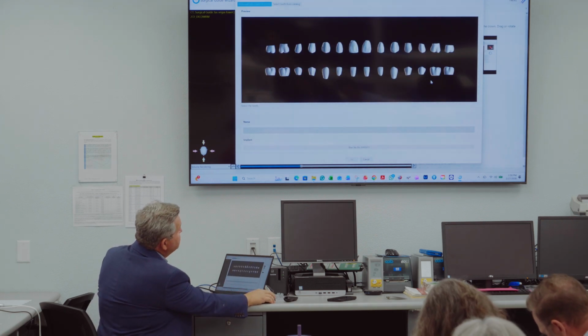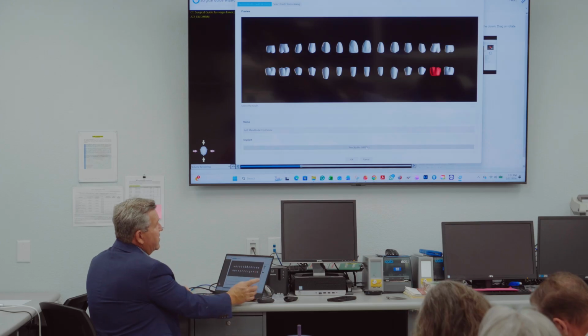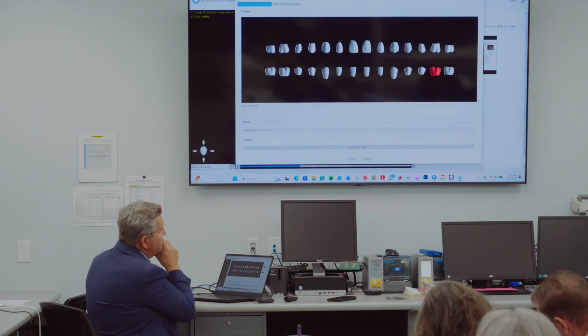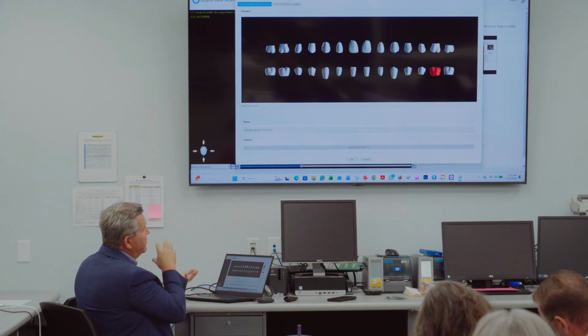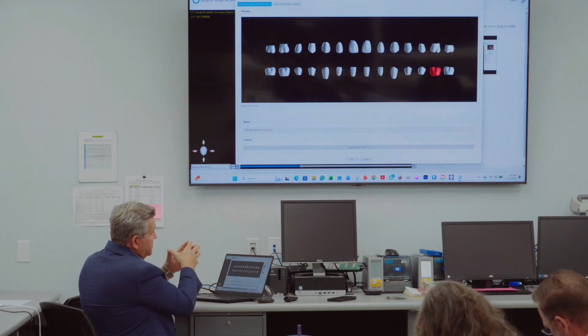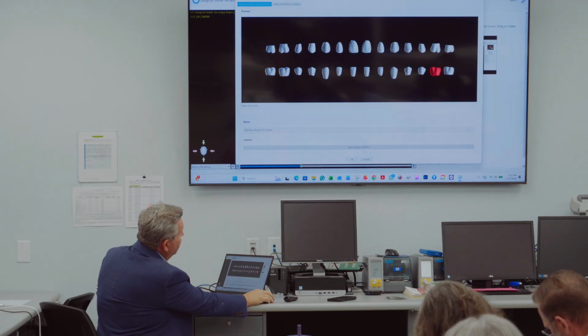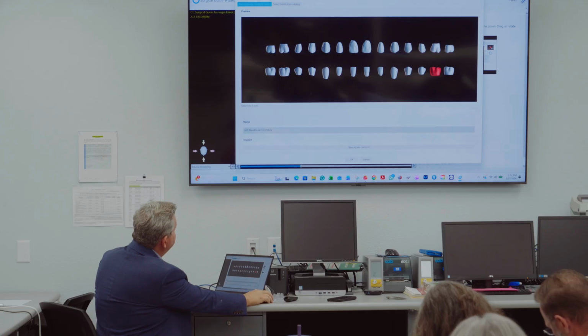This is an important screen, so we're doing tooth number 19. You want to confirm down here that it's automatically choosing. We had already set this to automatic implant choice. So based on the width of the bone, the volume, the width and length of the space in the bone, it's choosing a 5.0 by 11.5. Okay, so that's what it says down here.